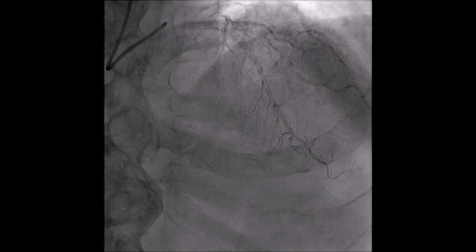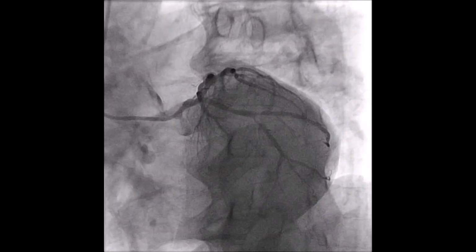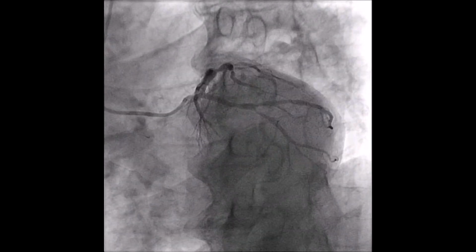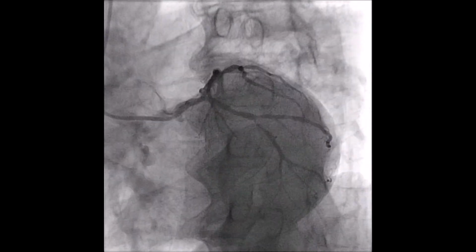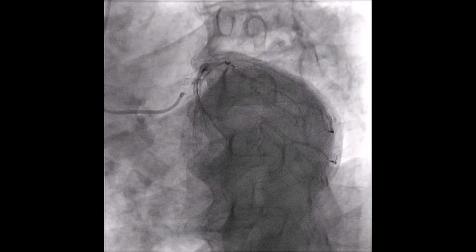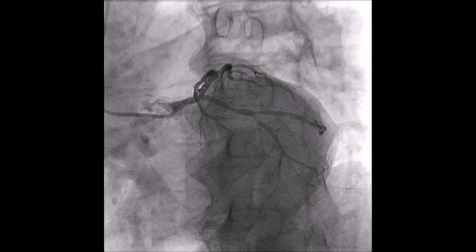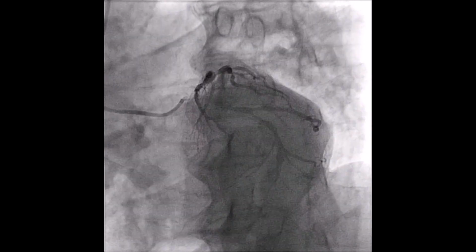Thus, recalling that the electrocardiographic alterations consisted in an inferior elevation of the ST segment, more pronounced in lead 3 rather than lead 2, and with a mirror image descent of the ST in lateral leads, it is easy to imagine that the occluded artery is the right coronary artery or one of its branches. Let's take a look at this vessel.